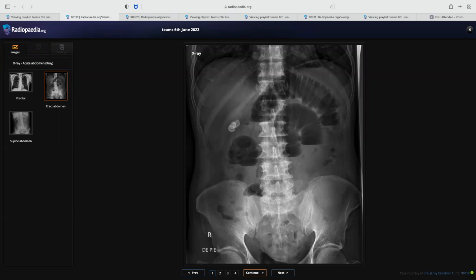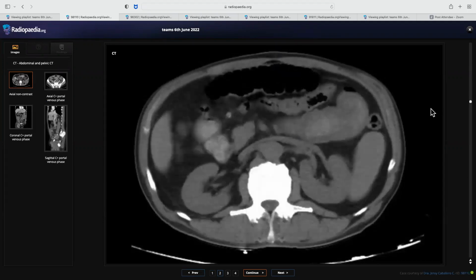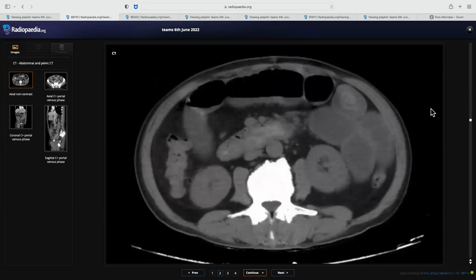So these can be a match, and besides that, I don't think any other infective etiology can present like this because there is a lack of pleural effusion and consolidations. So we did a CT scan, as you said, yes, you can go through the CT scan. Yeah, so can you please scroll it for me? It would be kind of you. Sure. Since I'm using mobile. Thank you. Okay.